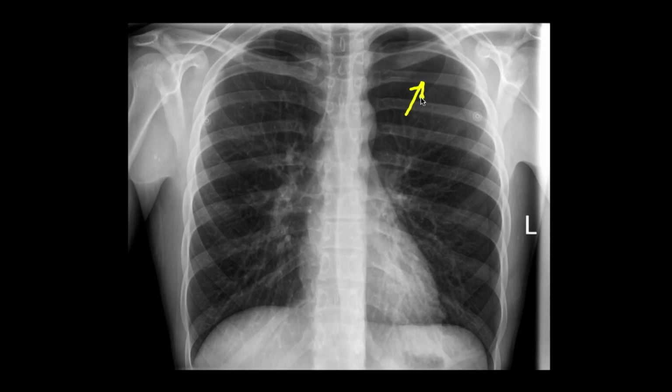I'll draw along the margins here. And you can see beyond the pneumothorax, you are no longer able to see any lung markings. So a fairly substantial one tracking along the chest wall. Once you do see a pneumothorax, obviously you want to look for associated rib fractures, but sometimes people can get spontaneous pneumothoraces, particularly if they're long, skinny individuals, and so they may not always have a precipitating history of trauma.